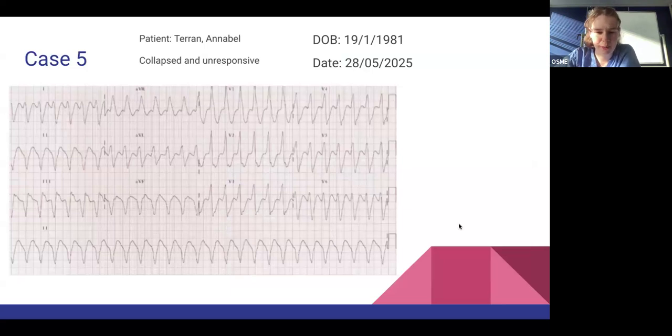It's difficult to describe this one because there's a lot of wiggles. You might know what this is, you might not, but give it a go. I'll give you kind of 20 seconds-ish. She's collapsed, by the way, if that helps.